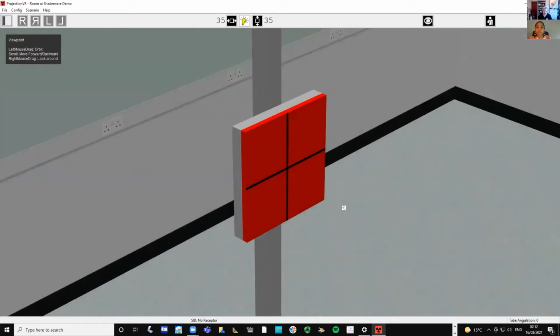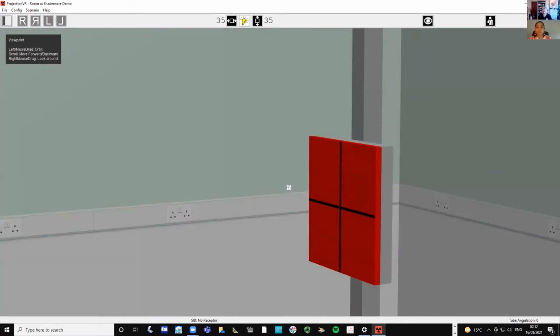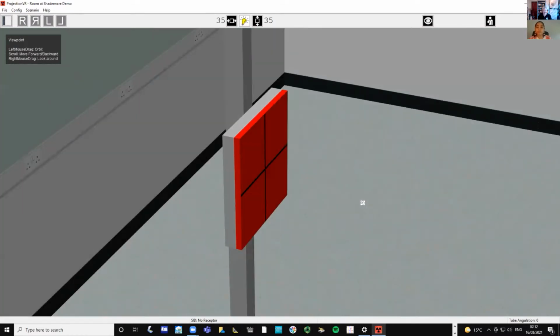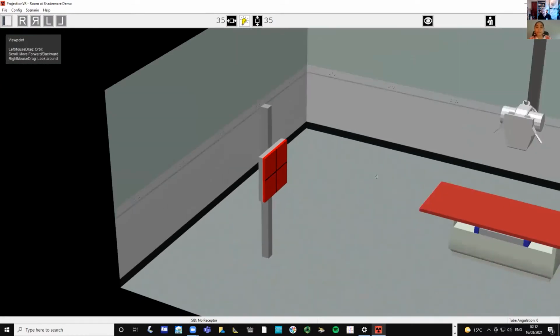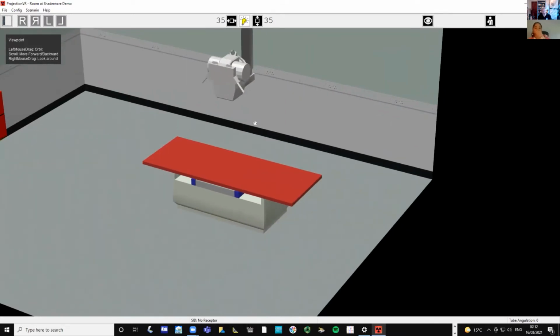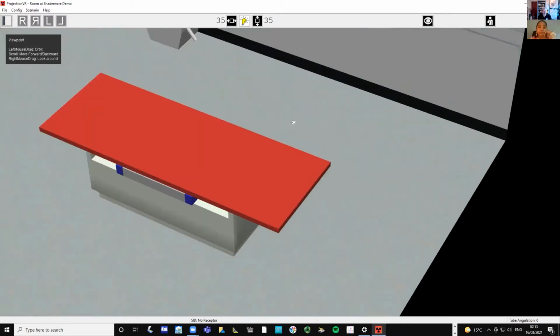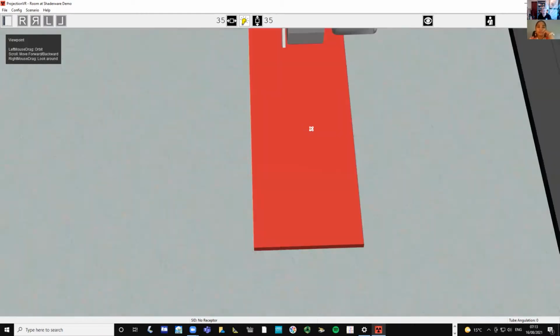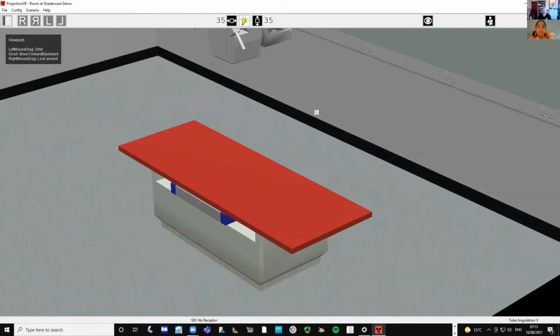So here, for example, I can now spin round and look at the erect bucky in detail by just making that adjustment. I can zoom out, move over to the table bucky, and now I can spin around that and look at that in detail. So it's that quick and easy to navigate the system.